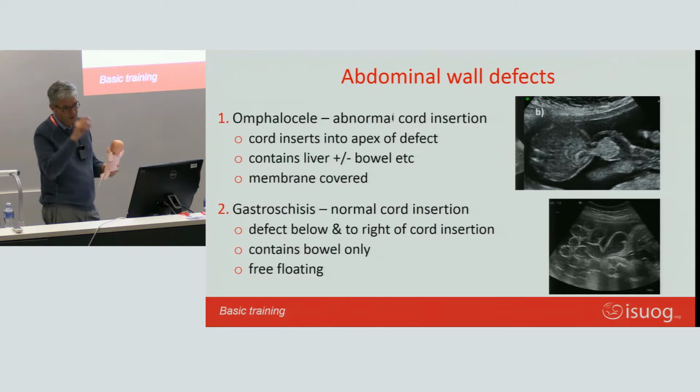So now the babies don't come tagged with that, but it can be huge, or it can be really subtle. The really subtle ones are the ones to watch out for, because if it's huge, the dad's going to stand at the door and say, what's that big thing next to the stomach? But if it's just this tiny little knuckle of bowel into the umbilical cord, those you must be worried about.